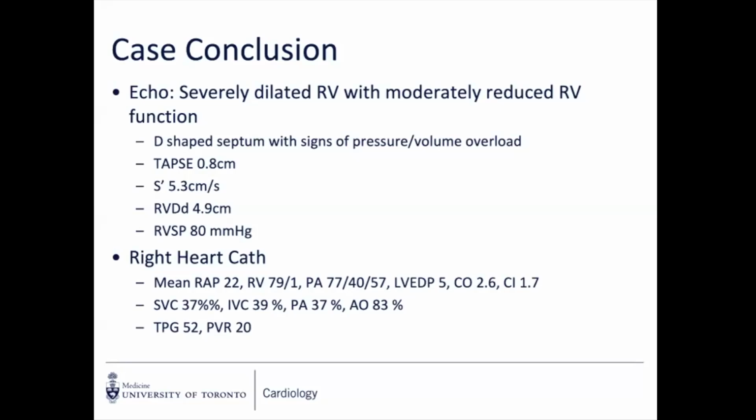And so when she came in with worsening dyspnea, she was quite hypotensive, hypoperfused, with lactate at 7 or 8. And so they weren't sure if this was all related to the large effusion, tamponade. Oftentimes, if you have right ventricular dilatation and pulmonary hypertension, you don't always get the signs of tamponade on echo that you otherwise see. And so to remove that as a potential confounder, they did a pericardiocentesis, just draining.